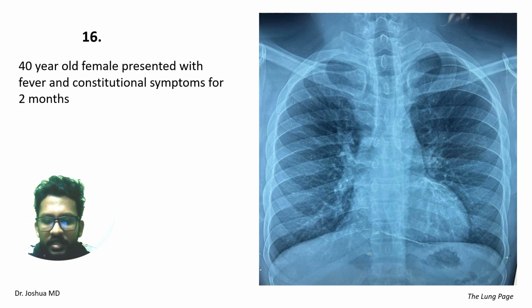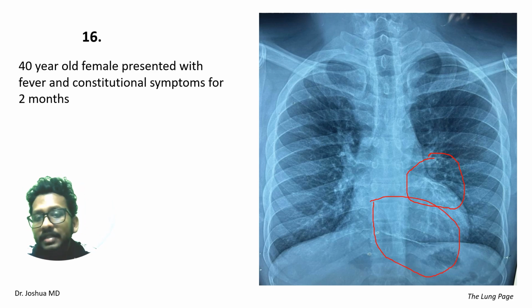So in this chest X-ray, as we all know, with the ABCD order, airway, bones, cardiac contour, diaphragm, everything is normal. So where's the abnormality? Where is your lesions you can find? When you see this chest X-ray, everything is normal, but you can see here there is a white color streak line above the heart border, and also you can see here also above the heart border there is a white color streak line.